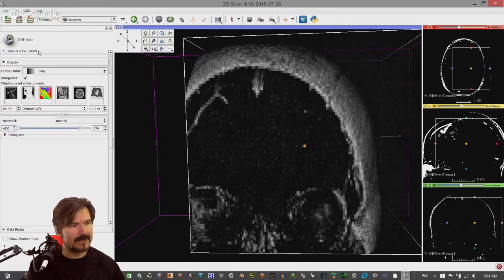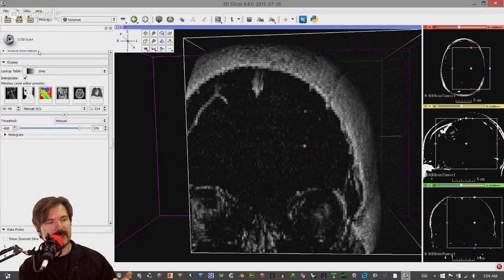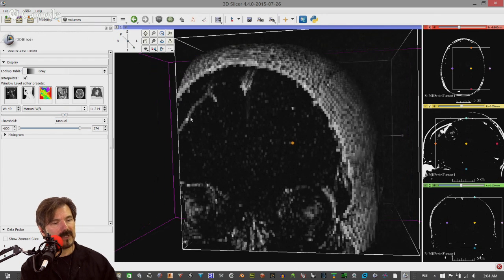So I'm not going to change the name, but we could continue to use this particular threshold and call it a certain volume. Remember how we could choose volumes. So we could modify this and say, all right, I want this to be a volume of a particular region. And we can go through this and use this to determine different information that we choose for some of the other applications. But I'm going to leave it like this.